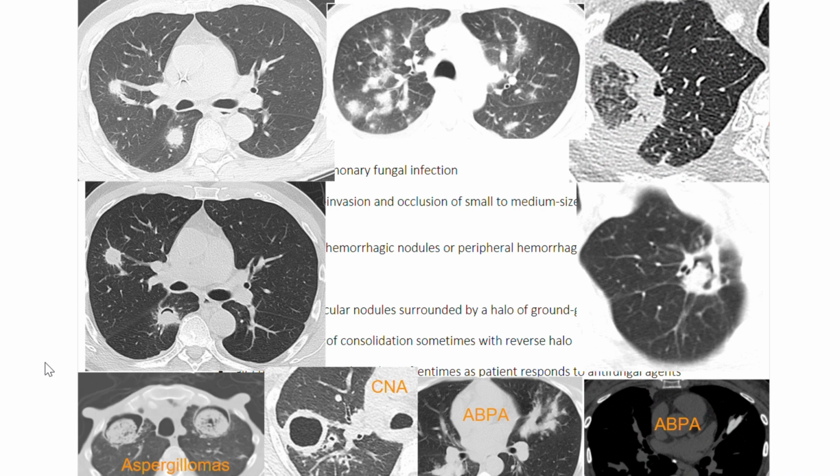This is what I heard some of the answers for my question. This is an aspergilloma on the left, and this patient, all the way on the left, had chronic PJP and had pneumatoceles from the PJP. And then Aspergillus decided to go in there and live there. So you can imagine this is someone who would literally say, I feel things moving around in my chest as I'm walking down the street. And these are bilateral aspergillomas.